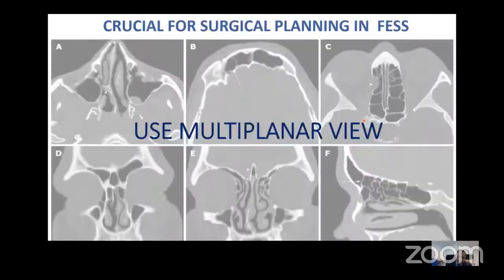Now, when we decide to list this patient for surgery, and before putting the instruments in the patient, I would strongly recommend that we go through these scans in the multi-planar or a coplanar view to get as much information as possible of the important structures within and around the sinuses before surgery.